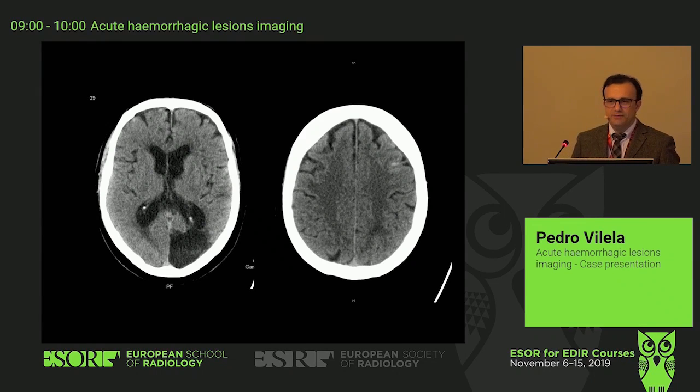Anybody want to help? Very good. So we have a very small bleed there. Probably it's either cortical or subarachnoid. Okay. Does this look like a rupture of a brain aneurysm? No. So we are in a different type of differential diagnosis, being the spontaneous cortical subarachnoid hemorrhage.